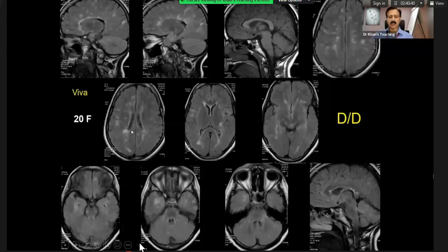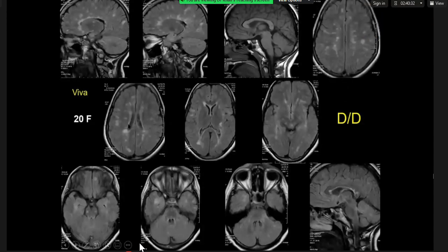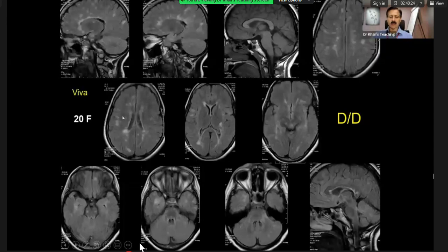Another thing which is given in the literature, that the plaques of demyelination as in MS, many of them can touch the ventricular surface. On the other hand, there might be up to 3 millimeter distance of white matter abnormality of small vessel ischemia, for example.